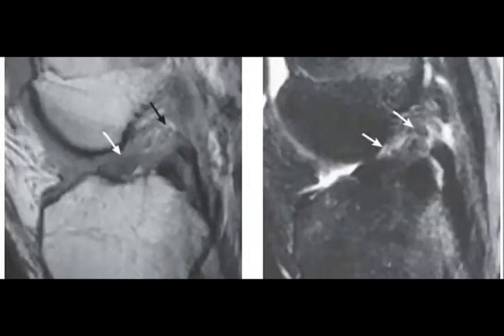So what happened here in this patient? Can you expect? Yeah, so anterior cruciate ligament tear. You can see that there is loss of the normal signal of this ligament, which should be like the PCL, so it should be low signal. Here you can see high signal, and the fibers are disrupted. So ACL tear, which is a very easy one.